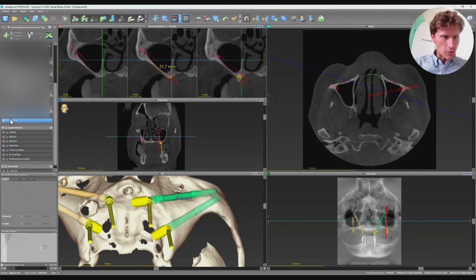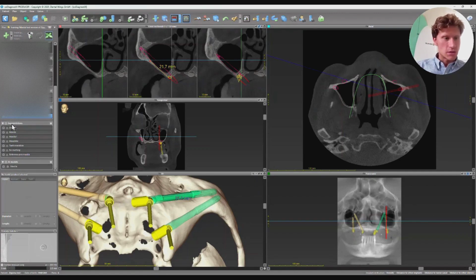So right now we have 21 and 7 and 35 and 2. And the next step, we need to create cylinders as we will subtract from the next surgical guide. And for this, I need to create an STL file.